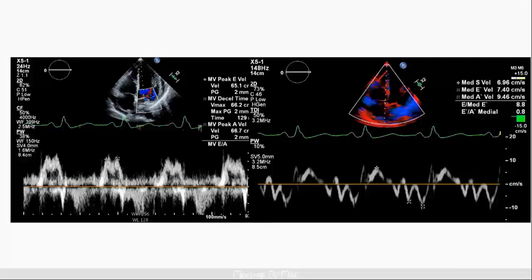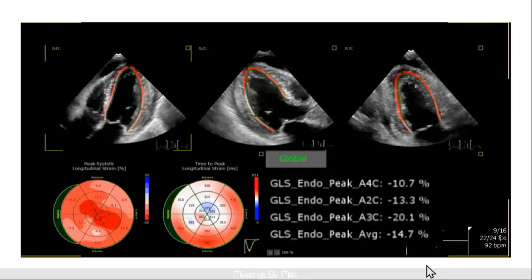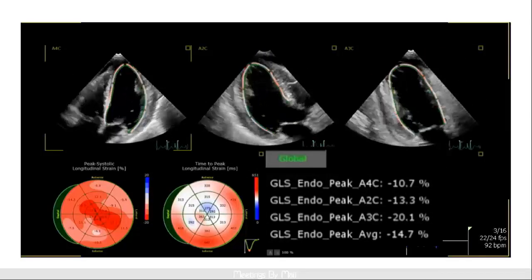So, some of the diastolic function. What stands out very importantly is how abnormal the tissue Doppler filling pattern, the relaxation pattern, is. And you can see a very strong IVRT wave, which is basically prolonged, and this is the E wave, the A wave, and you have evidence of a myocardial relaxation abnormality, and that's also translated when you do the global longitudinal strain assessment.